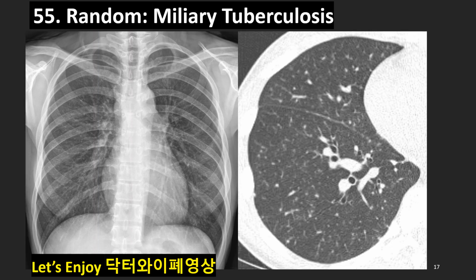Now let's get into the last room. The last room shows a random distribution. Let's see, what is random distribution? Do we see the pleural nodules, fissural nodules? Yes, we see fissural nodules, pleural nodules, but not so many. Anyway, there are pleural nodules, and the micronodules are scattered everywhere, very small.